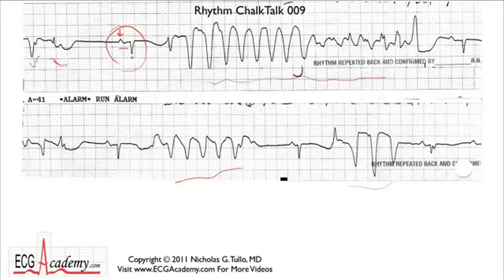It's almost 0.2, I'd say, and a QRS that's narrow, and so great. So now we have, after a short pause of maybe 600 milliseconds or so, the beginning of this run of something. And the first beat almost kind of looks like the normal beat, except the R wave's a little bit taller and it looks a little wider, and I'm not really sure about that.